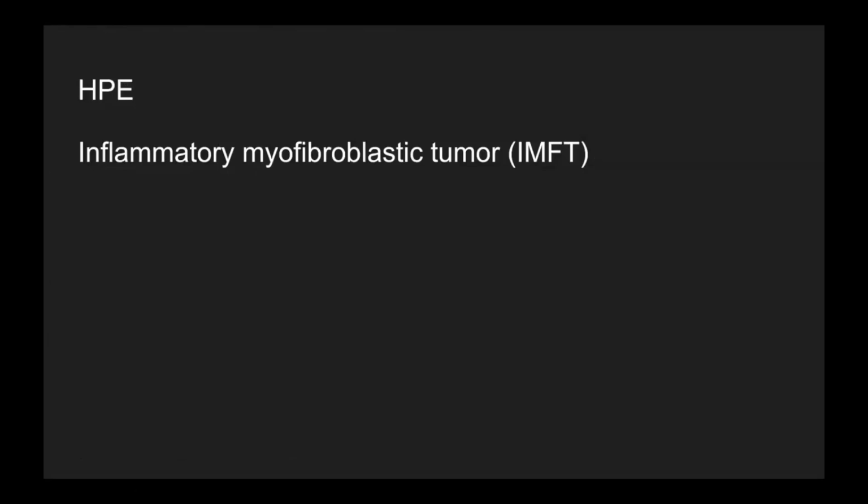As you see, all of the opaque hemithorax, the 5 cases that I showed, all had very different appearances and very varied causes. Some of them are very unusual, but just keep in the back of your mind that such kinds of appearances may also happen. Some of them are once-in-a-lifetime cases, but if we know, only then can we diagnose it later on. Now, I will show 2 cases of lung ultrasound, and how lung ultrasound can help us, be it bedside in the ICU or in your routine OPD setting.